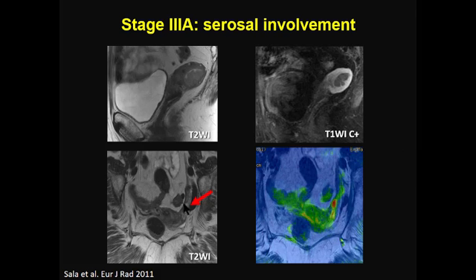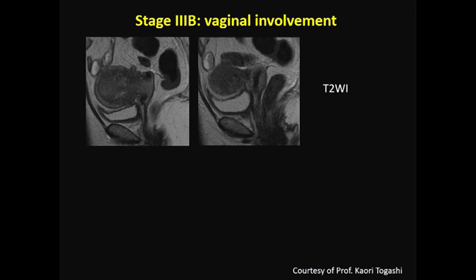And you can go back, I can see the adnexa here. You can see there is a really indistinct area. We called it because the serous papillary was very restricted on diffusion, and the CA125 was high, and indeed it was an 8 millimeter deposit on the surface of the left ovary adnexa. So that's a very nice case given to me by my colleague and friend, Professor Togashi from Kyoto.